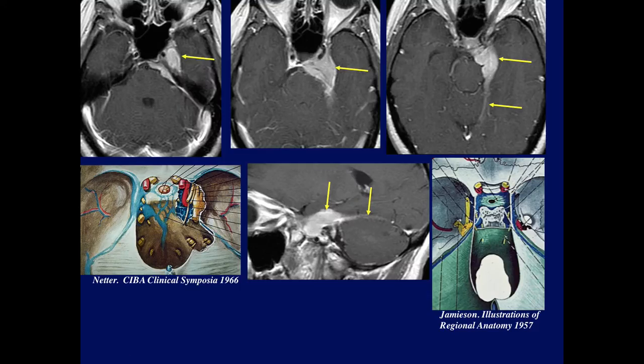So that's why it's not unusual many times when we initially look at meningiomas that we'll have extensive involvement of the cavernous sinus and Meckel's cave, and here we can see how it's extending along the free edge of the tentorium. Also on the sagittal plane, we can see the free edge involved. So it's very easy then for the tumor to extend posteriorly along the tentorium.